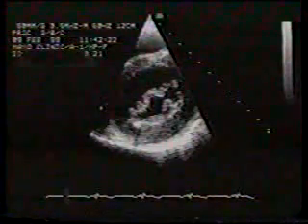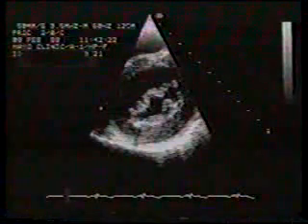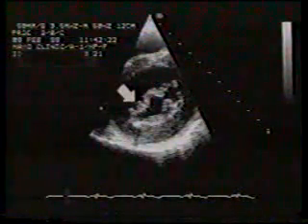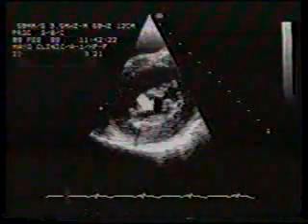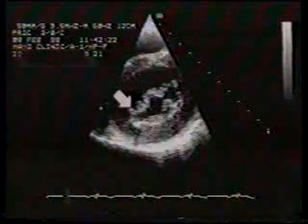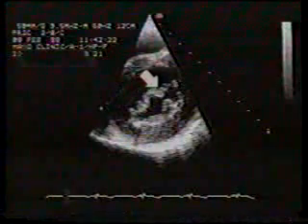This patient has mitral prolapse. In this short-axis diastolic frame, the redundancy of the leaflets can be appreciated. Note that the leaflets appear thickened. The excess tissue also leads to folding of the leaflets, as evidenced by the multiple surfaces.